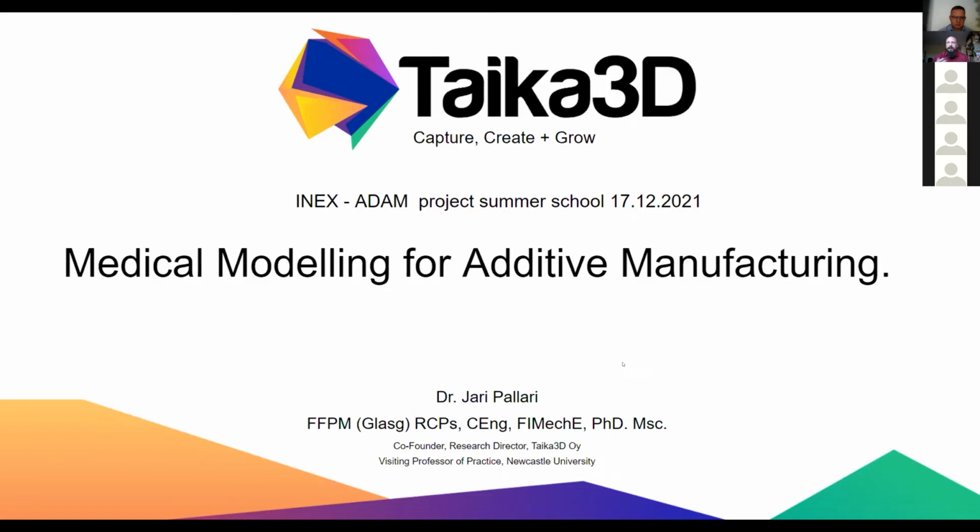If you design something just one at a time manually for certain really complex cases, you probably don't have a choice. But in most cases, you are dealing with very similar shapes with custom geometry, which is difficult to work with, but basically the process that you take in your design is very similar from one patient to another.